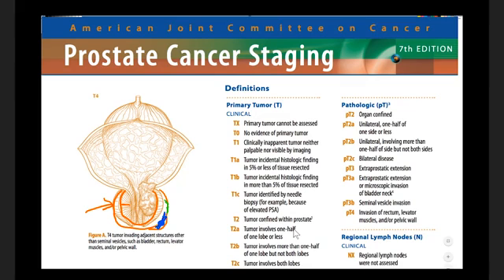Now the literature says about 1.2 is when the hairs on the back of your neck should stand up. But as you get above 1.5 and 2 centimeters of capsular contact, the likelihood of capsular invasion starts to go up logarithmically rather than linearly. So that 1.2 to 2 centimeters of capsular contact is kind of a critical area. And when you're above 2 centimeters of capsular contact, it's highly likely that you have microcapsular invasion, even though you might not see the surrounding fat infiltrated by the tumor, the surrounding fat represented by our white background.